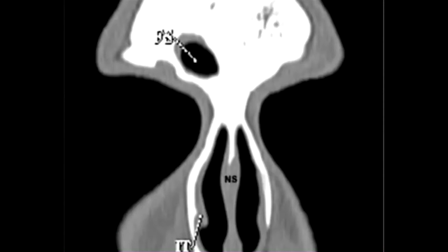nose. And then if you keep going back, then you start to see frontal sinuses, so these are the sinuses that appear first. And again, you see the nasal septum, and you start to see a bit of white there, which is bone, and that's called the perpendicular plate of the ethmoid, which is a projection that comes down from the ethmoid bone in the skull base. And then you also start to see the front, or the anterior part of the inferior turbinate. Those are the side projections.